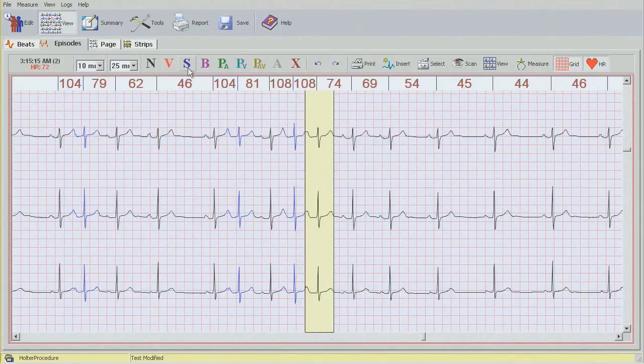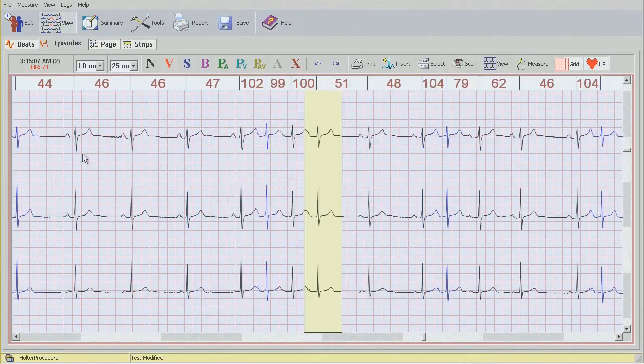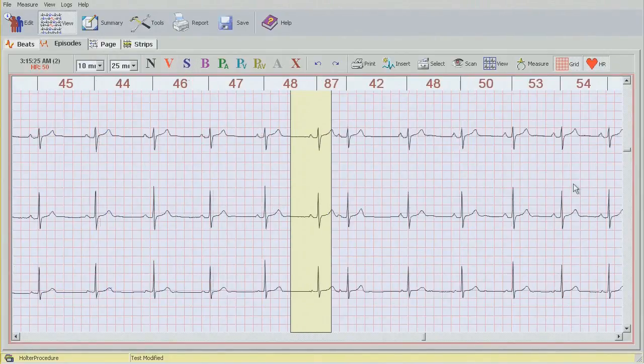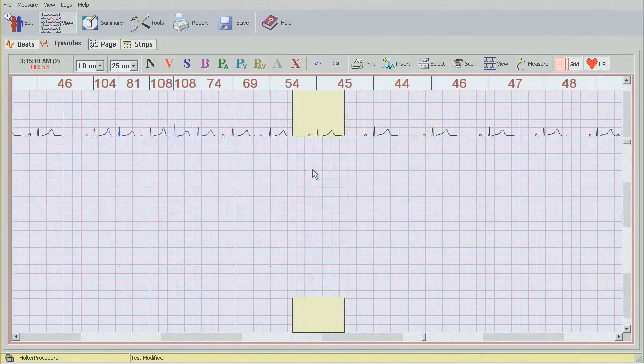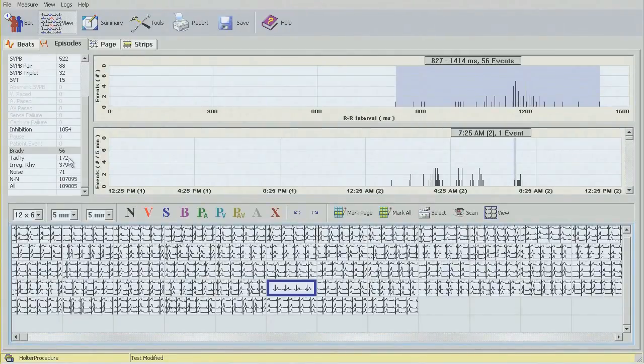There's actually a few here. So I'm going to change these two as well. And have a look at the one that we originally wanted to check. So everything else seems to be okay. So Z button to go out of there.